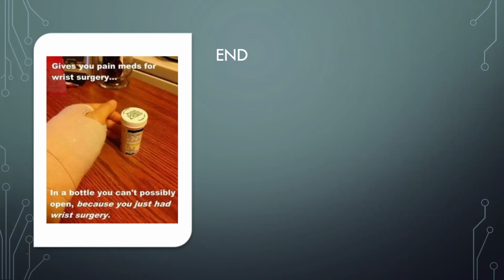Like I say, the reason for me doing this was that I've seen a lot of our younger doctors just pick up the X-ray, look at it, get this confused look on their face and kind of put it back like, okay, we had the X-ray done, but we don't know what to do with it. So I hope this made sense. I hope this helped you guys to know why we look at a lateral X-ray, and that you'll be able to look at them in the future and be able to judge them as well.